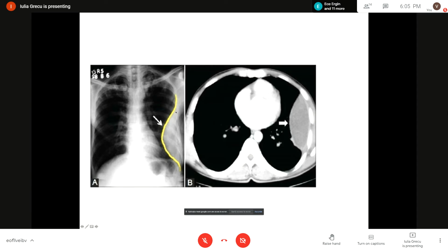It is a left laterothoracic opacity here, which is quite homogeneous. It is well delineated towards the lung, a bit blurred towards the chest wall. It has quite intense structure compared to the adjacent ribs. It is quite big.